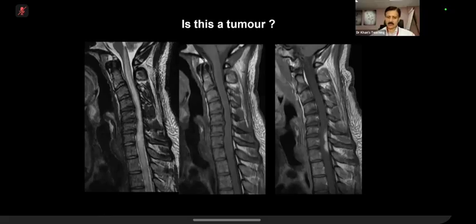Here what is happening, again, go back to your pathology and make your radiology. Something is sitting on the leptomeninges and then it is going into the parenchyma. From the leptomeninges, it goes into the parenchyma. Even here, if you see carefully, you can see something is there and then going in. And there is a lot of secondary edema. So, an intraparenchymal lesion, with the pia mater sitting on the cord, so leptomeninges as well as dura mater. What comes to your mind?